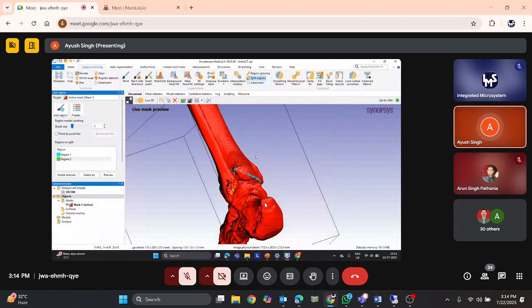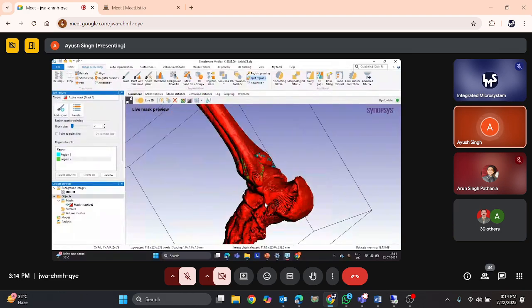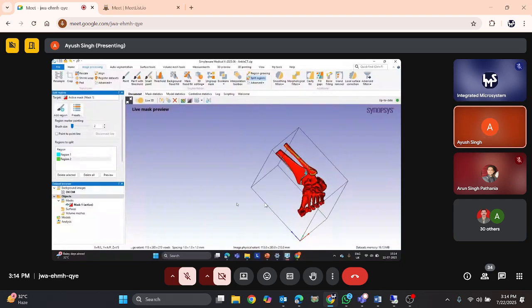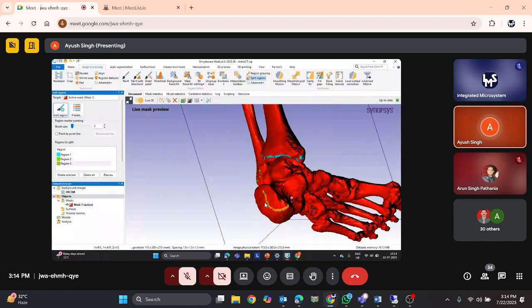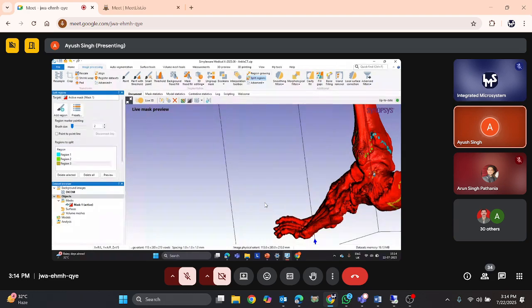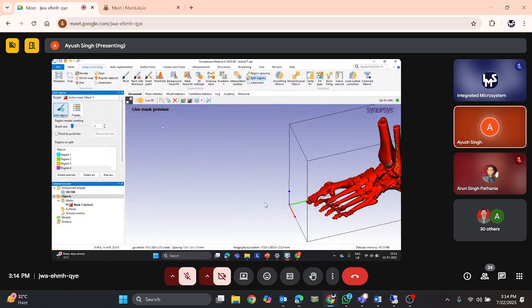Whenever we are marking the particular boundaries over here, we need to take into consideration the region in which two different parts are getting separated out. Similarly, we need to have this ankle bone. I'll click over here and mark it accordingly. And generally, we can look at any skeletal system or any images from the web to mark the regions in a very precise way. Once we have done that, we keep our focus on separate entities within this mark.